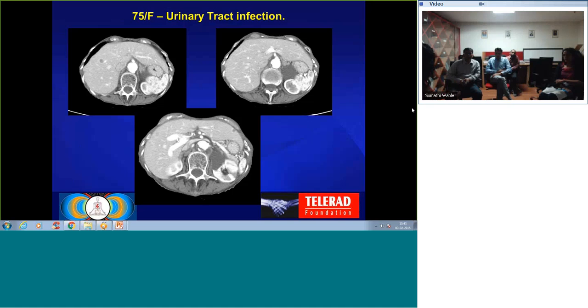Of course, the smaller ones are going to be difficult to biopsy. Typically, smaller lesions up to 2 centimeters don't get points for transplant. So they just wait, and if it is 1.8 centimeters, they will say, can you make it 2 centimeters, so they can push them off that list. Once it is 2 centimeters, you almost always are able to tell which way the lesion is, whether it's just a dysplastic nodule. Nobody calls it a dysplastic nodule.